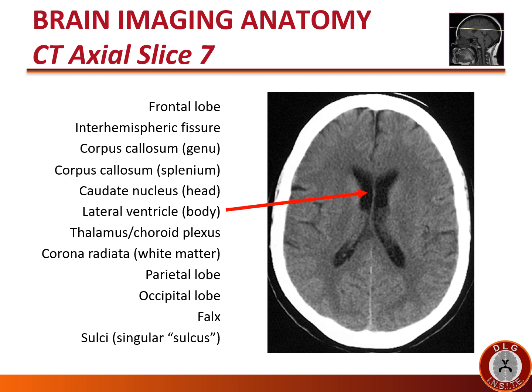At this level, we see the body of the lateral ventricle, the large black CSF structure in the middle of the brain. The bodies of the lateral ventricle arch over the thalami, and on top of the thalami lies the choroid plexus. In this slice, we see the thalamus or choroid plexus seen as a consequence of volume averaging, seemingly within the ventricle, but actually just beneath the ventricle.